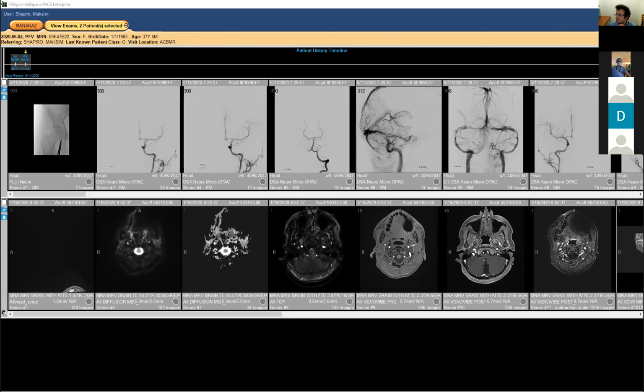Most of the time this is hypoplastic. We don't see it so much. It would require us to really understand the fine anatomy of this tentorial sinus that Max is calling, and whether it is distinguishable from a meningeal vein. And I don't know the answer to that.